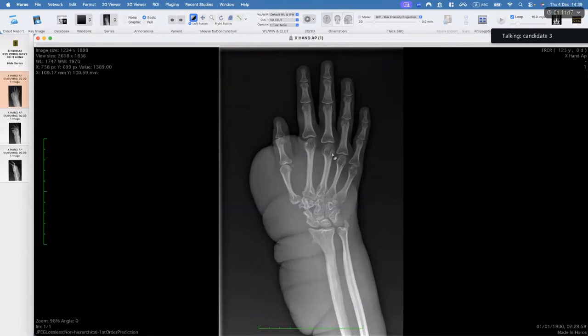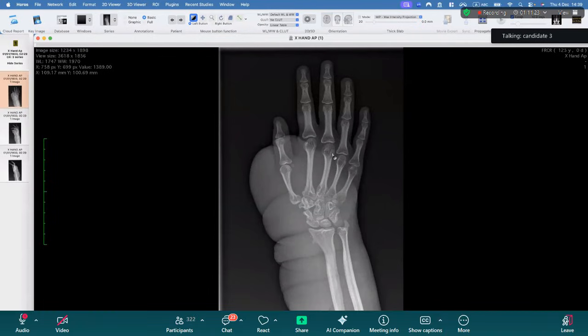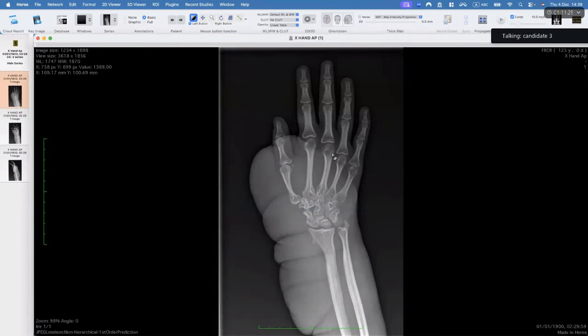I am presenting a radiograph of a skeletally mature patient, hand, frontal view. I can see narrowing of the shaft of the visualized metacarpal bones associated with irregular surface of the carpal bone and irregularity in the articular surface of the metacarpal joints and the radiocarpal and the ulnocarpal joints.